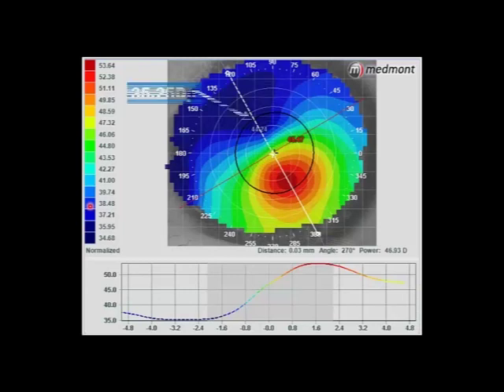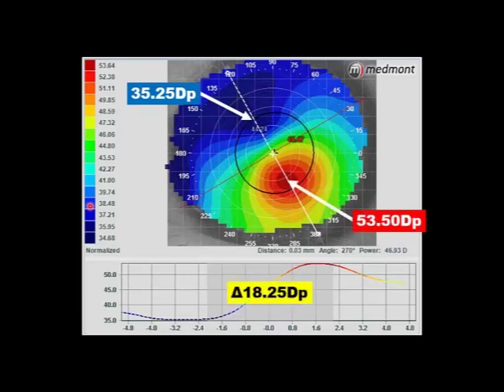Another thing we could do is if we click our cursor in the darkest blue, we can read within the pupil. The reddest, we can read within the pupil. There's an 18 1/4 diopter distribution of power across this eye. This eye is very toric, a very asymmetric surface. So there's an incredible amount of power that this patient has to try to discern through to be able to have quality vision. And clearly spherocylinder refraction is not going to provide this patient with an exceptional level of vision. So clearly a GP is the right call.